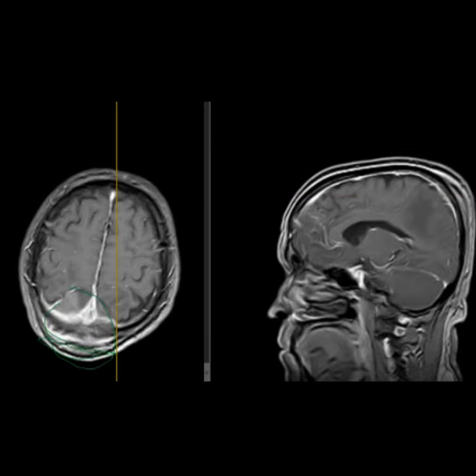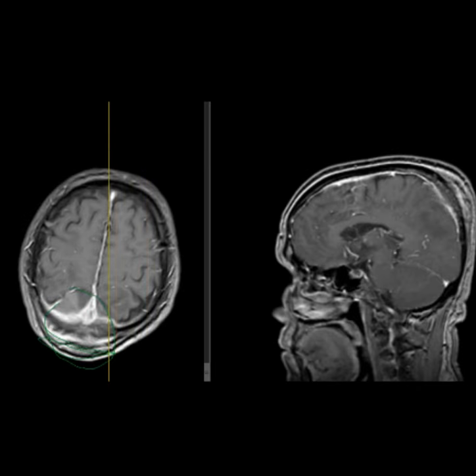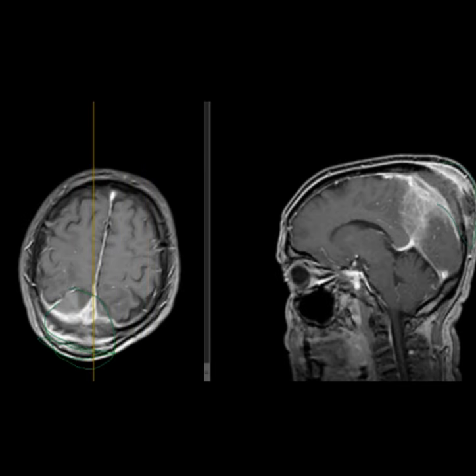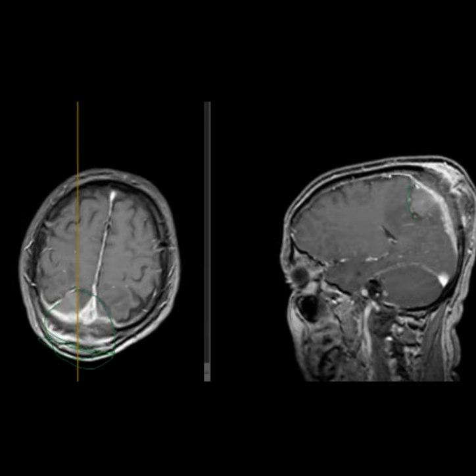And on the sagittal images, we can see almost the same findings. You can see the lesion here and extending both intracranially and extracranially, and it's causing mass effect on the deep brain parenchyma. Okay, so can you summarize your findings, please?